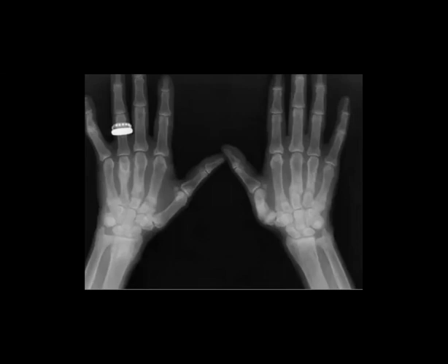So now when you go to osteomalacia, do you remember what is the characteristic with osteopenia? And the fracture is not a fracture, they are something called Looser zones. So Looser zones again with osteomalacia, yeah.